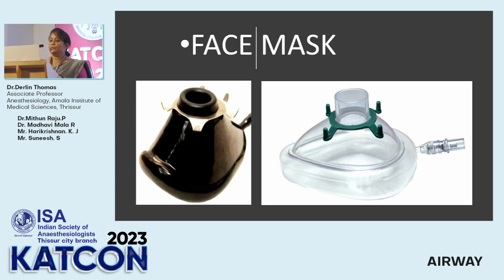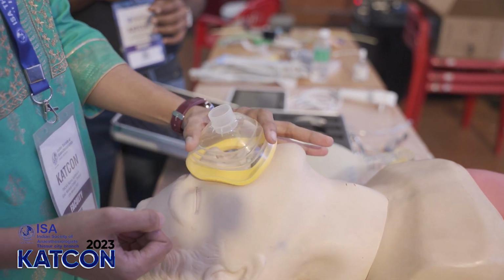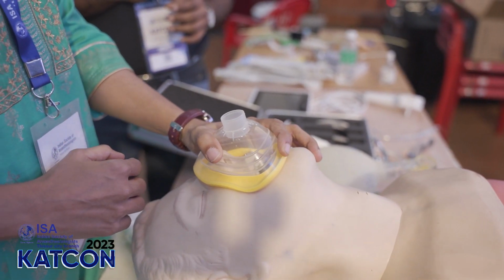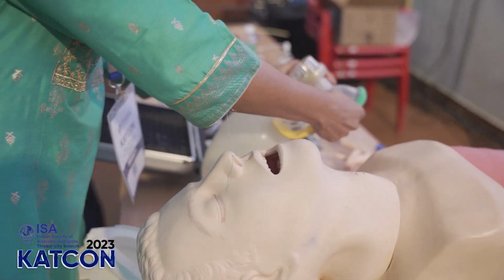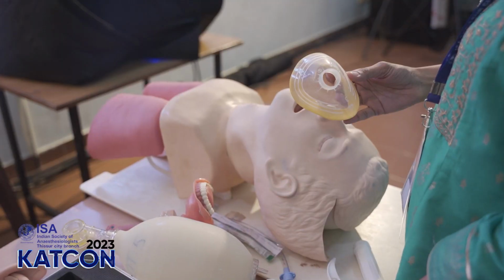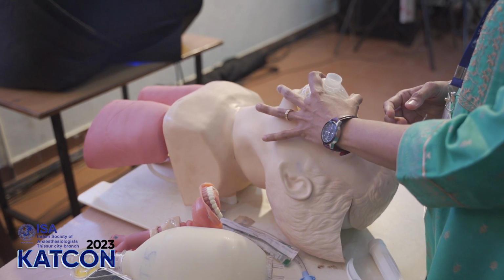First, we'll be showing you face masks. As you can see in this picture, these are the masks which we use for mask ventilation. The first one is the anatomical face mask, and the second one is the transparent face mask. There are different sizes of face mask according to the size of the patient, and depending on the size, the mask is also color coded. She's showing two different types of masks, color coded. You may see the other ones, most commonly the one on the left, the black one.